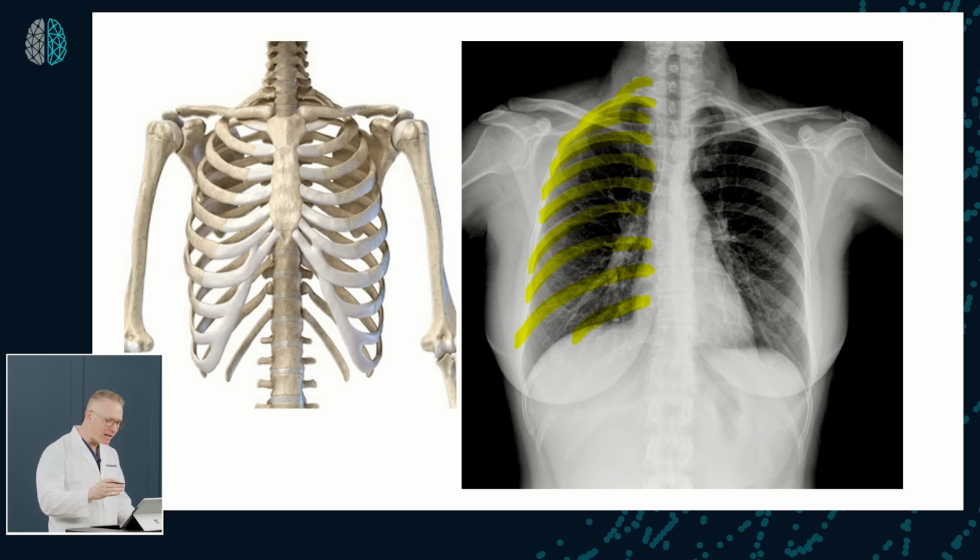They attach at the breastbone, the sternum, via cartilage, okay, and they are obliquely coming downward and curving near the midline.